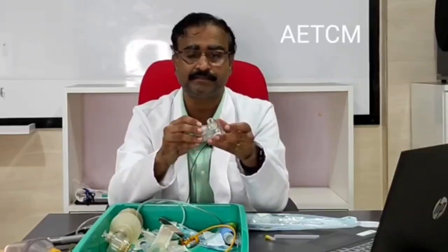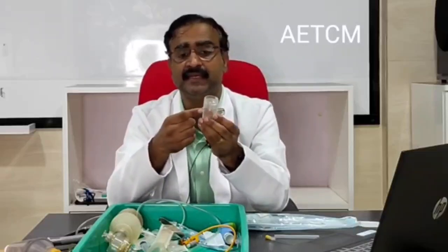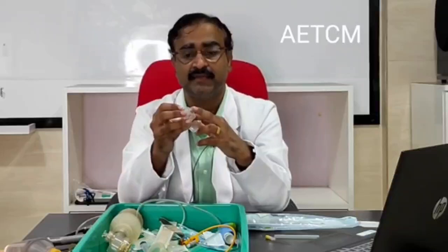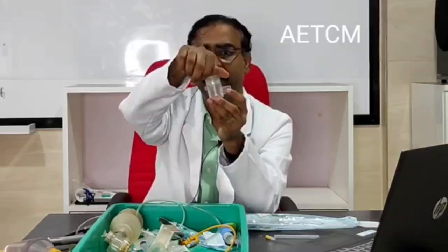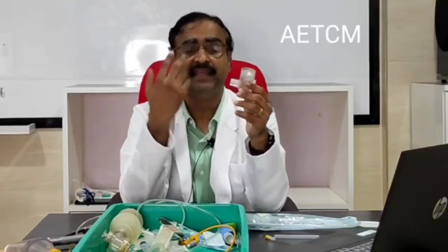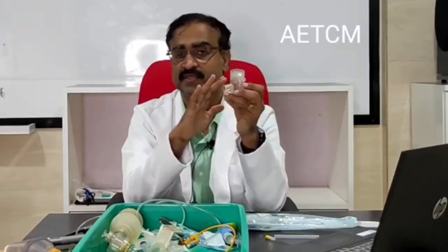The next instrument I would like to discuss would be the rotahaler. So the rotahaler is this apparatus. It has an outlet and an inlet. The inlet is a place where you will be putting the rota cap. Once the rota cap is inserted, this chamber has a capsule breaker. As you rotate, this capsule breaks and falls into this chamber. The child is asked to put this device in his mouth and inhale deeply, not just once, maybe 3 or 4 or 5 times, till the powder completely vanishes from this chamber.